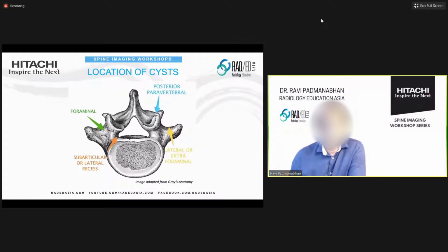So that's basically within the canal. It can sit in the foramen. It can be in this far lateral or extraforaminal region. So that means it's outside the foramen. Or you can get these posterior paravertebral cysts. Now, the importance of this is that depending on where the cyst is sitting, a different nerve root will be affected. And again, we're going to go into which nerve roots will be involved.